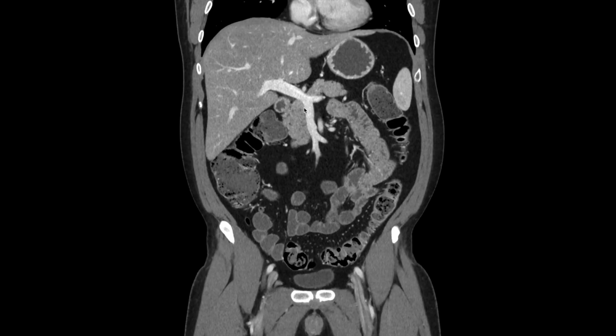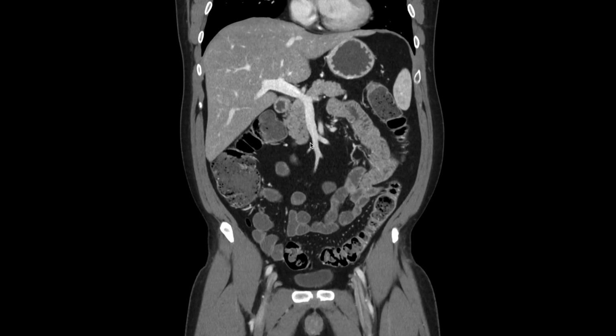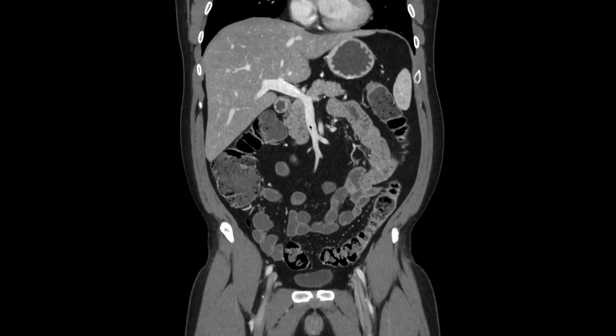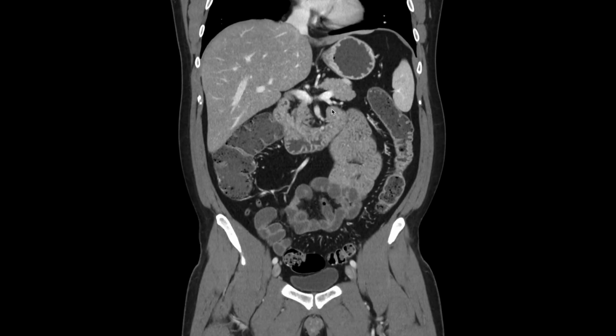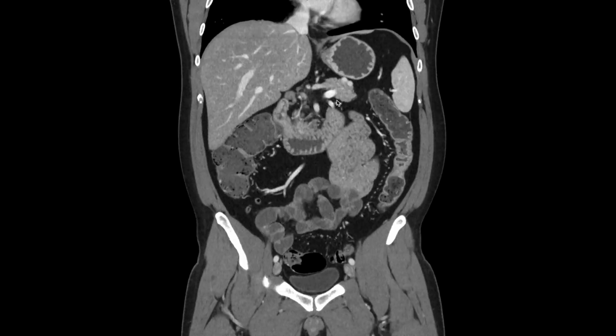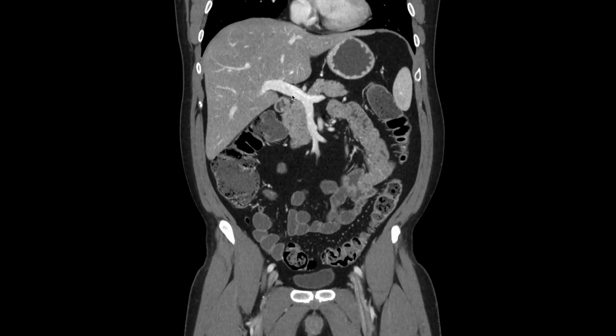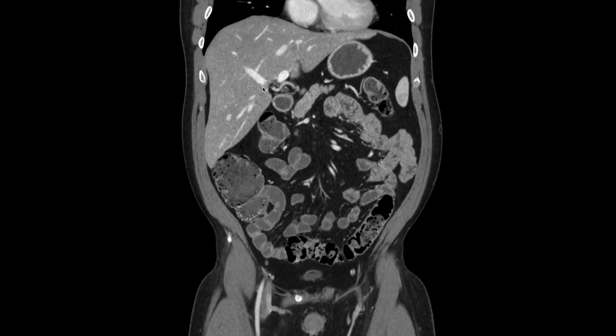And now we can review the vasculature. So I start with the veins draining to the liver: superior mesenteric vein, splenic vein, and then here's the inferior mesenteric vein joining the splenic vein. And these form the portosplenic confluence, supplying the portal vein and intrahepatic branches of the portal vein.